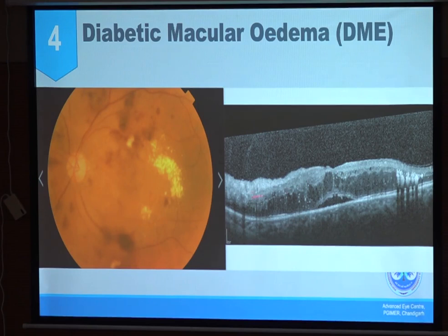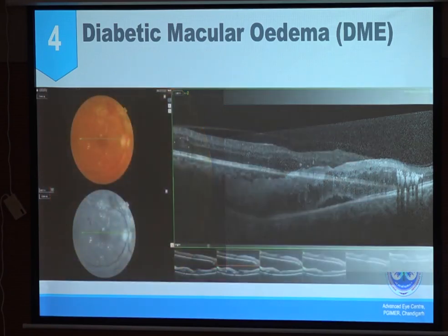And now again you can see here the inner layers of the retina are kind of mashed up. That is something called DRIL, disorganization of retinal inner layers, which tells us that the blood supply coming into the retina is disrupted over there, hence these layers are gone. And of course you see the intraretinal as well as the subretinal fluid that we mostly treat in these patients.